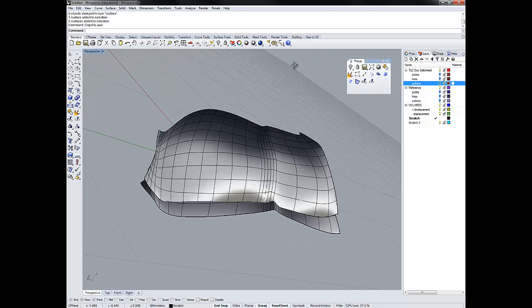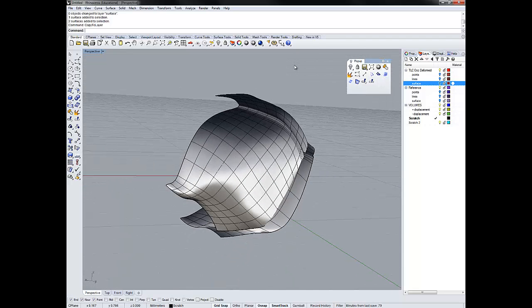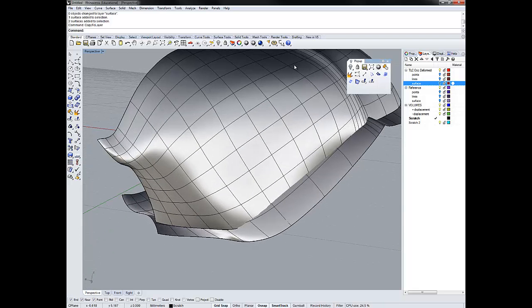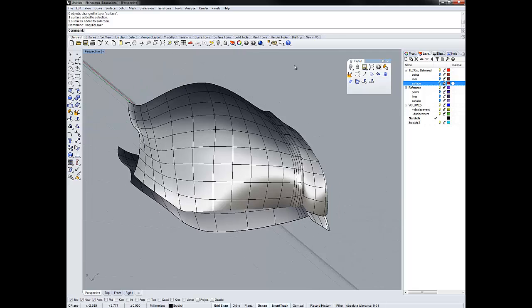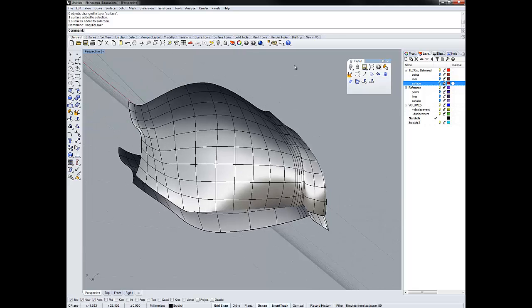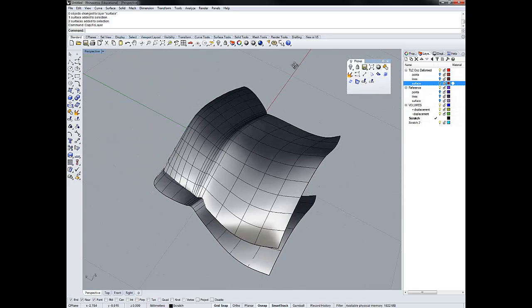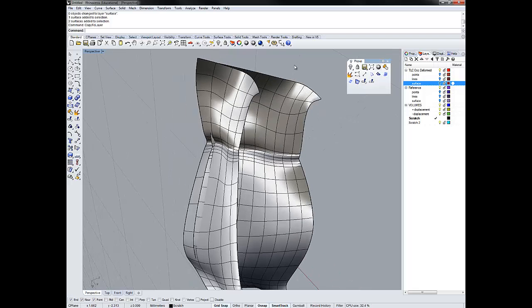So the same rule of thumb applies for the volume segments as does the lines and the surfaces. And so we want to try and minimize error. Because we have points taken directly from the surface of the diaphragm, the difference between the controlled and the experimental is a simple linear transformation. So in this case, we are going to just draw a surface from here to here and from here to here. So let's start defining our positive and negative regions. In this case, we're going to have one large positive displacement and one small negative displacement. The negative displacement is going to be right here. You can see that. The positive displacement is going to be this region right here.